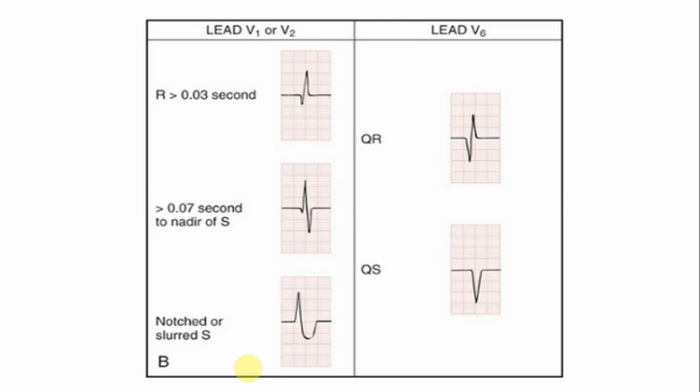Sorry, I think I messed up. So in left bundle branch block morphology, if you find Josephson sign, this is supposed to be VT. And in case of the right bundle branch block morphology, if you find a left rabbit ear taller, that is supposed to be VT. If you look at the left bundle branch block morphological pattern in V6, if there is a QR wave or predominantly QS wave. Now if you carefully look at it, V6 is the same in case of both right bundle branch block morphology and left bundle branch block morphology in case of a VT.